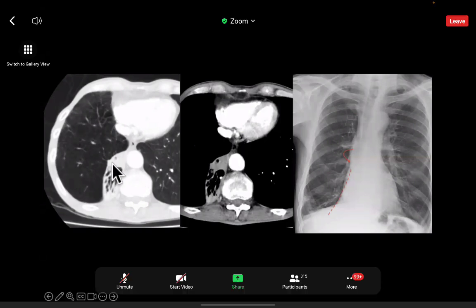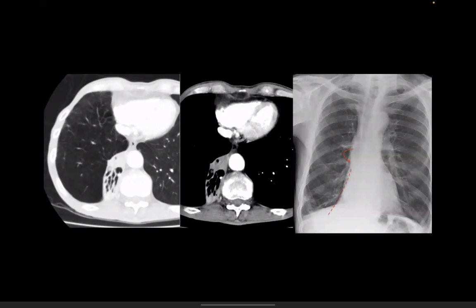Now, again, we've got the golden S sign, and that is almost always a bad sign. It's a sign of malignancy. And this patient has also got emphysema. So when patients present for the very first time with a lobar collapse, and they are over the age of 45, often with a smoking history, it's got to be an endobronchial tumour until proved otherwise.